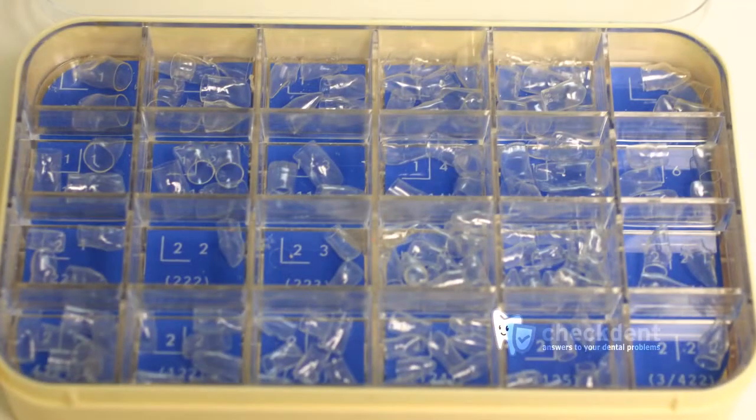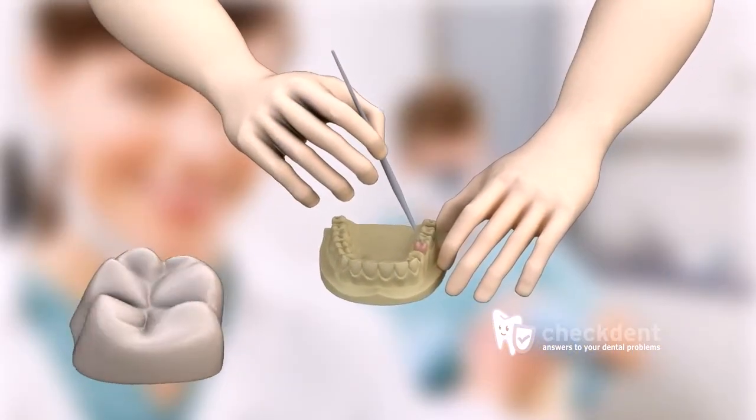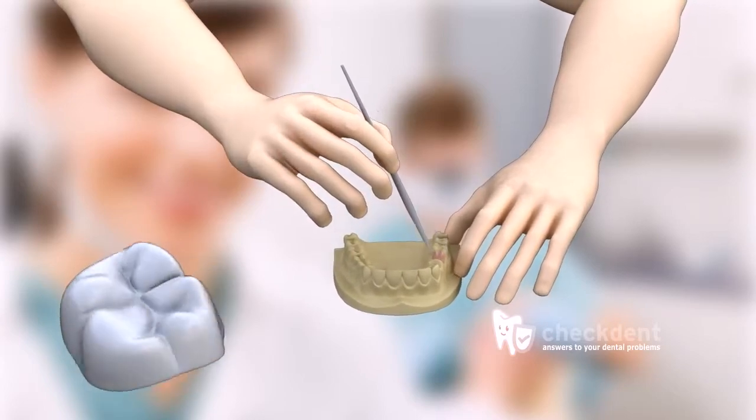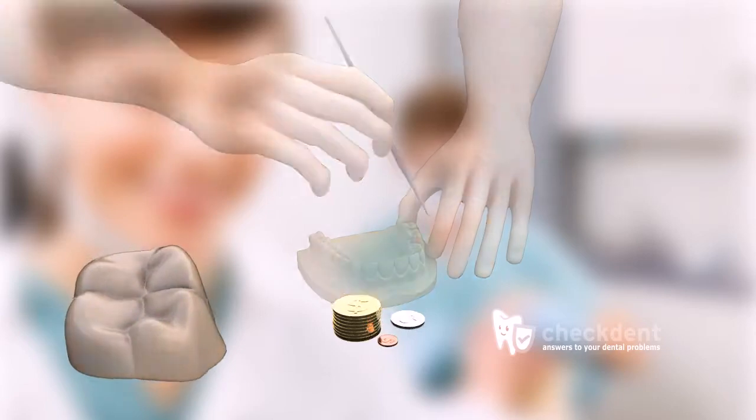The crowns in the other picture have been made out of a prefabricated shell, and they have been painted according to the color indicated by the dentist. The technician never saw the patient. This is quick and less time-consuming, and so costs less money.